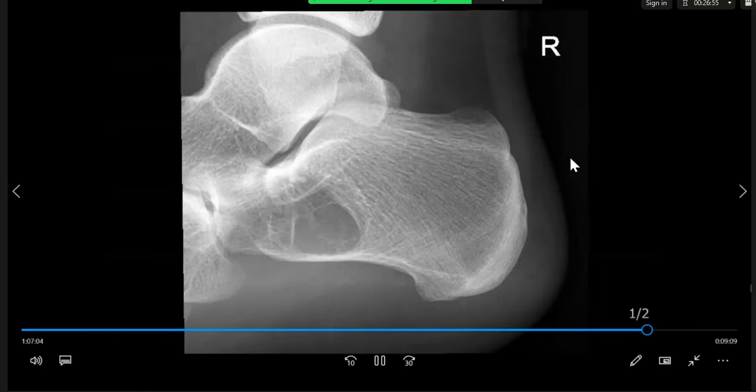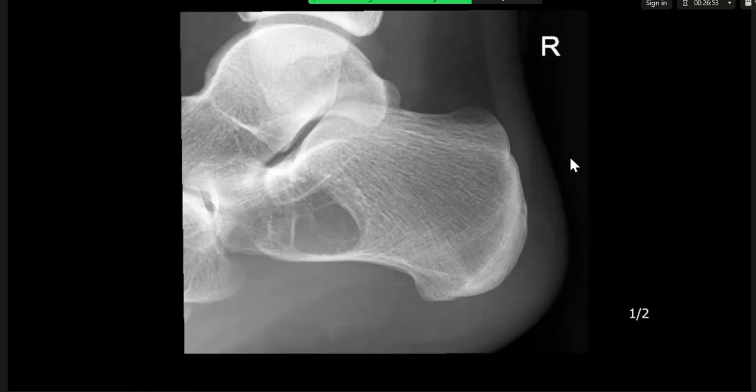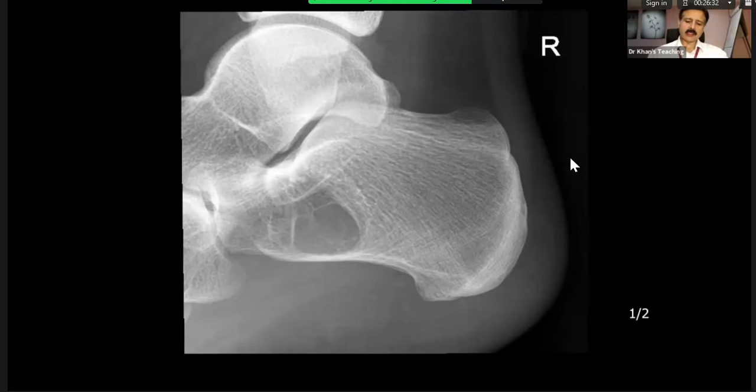They make me consider that might be some matrix calcification, in which case I think this lesion is consistent with an enchondroma. A differential would be a calcaneal intraosseous lipoma, which, if chronic, could potentially have a bit of calcification within it. I think the lesion has benign features, and there's no periosteal reaction or soft tissue mass. What will you do next?